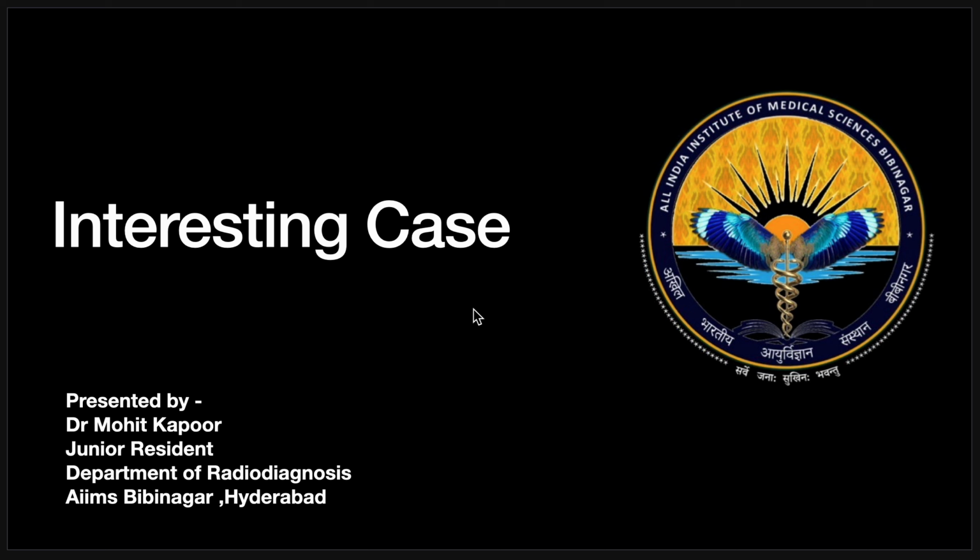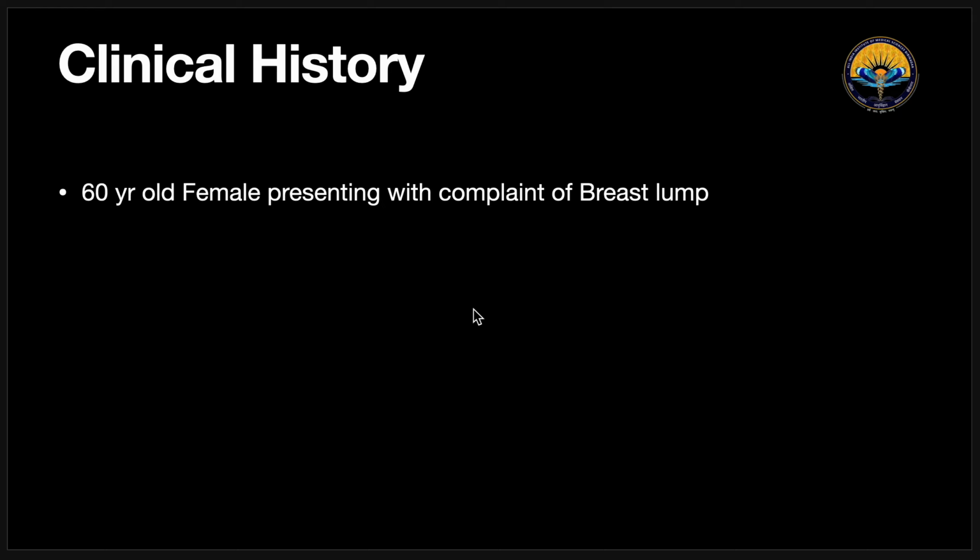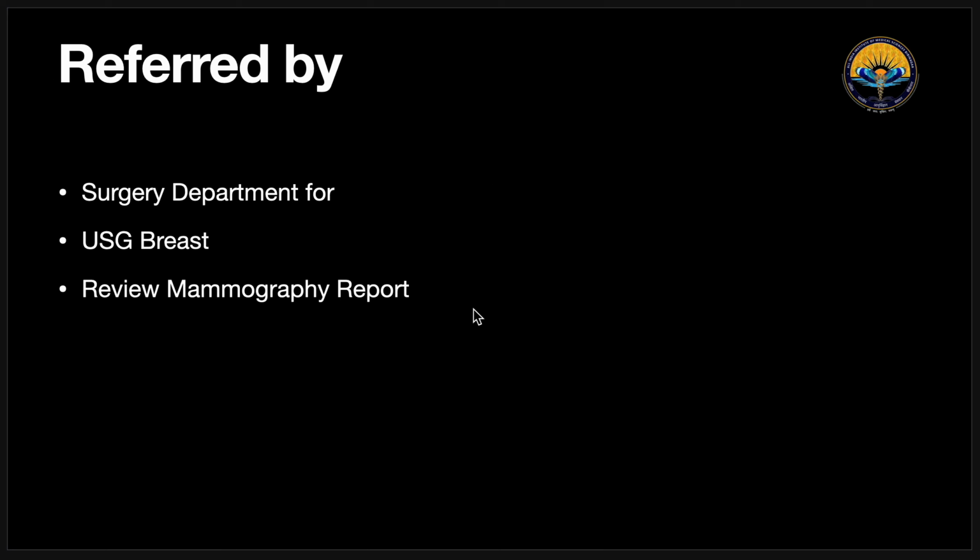And today, in this lecture, I'm going to discuss first a clinical case with you, and second, I'm going to discuss ultrasound BIRADS. So, starting with the clinical case first. This was a case of a 60-year-old female presenting with a complaint of a breast lump in the left breast, and she was referred to us by the surgery department for ultrasound of her breast and to review her mammography report.